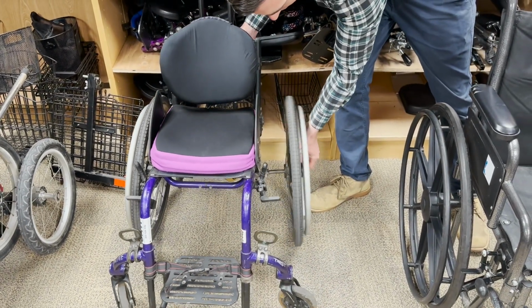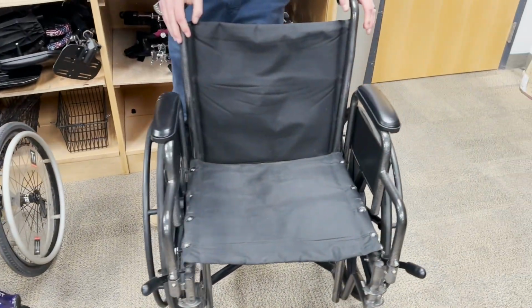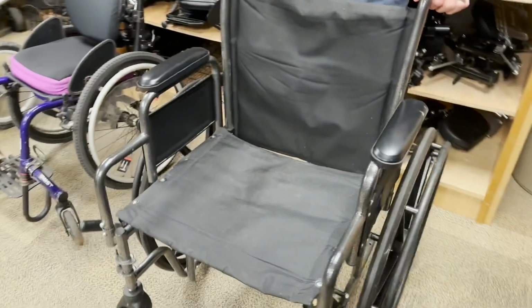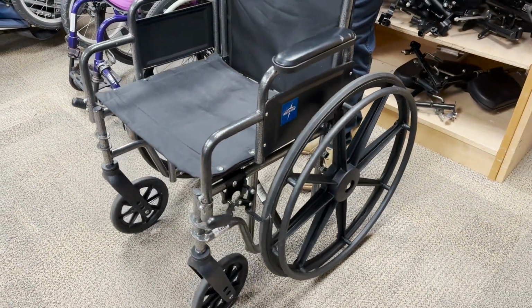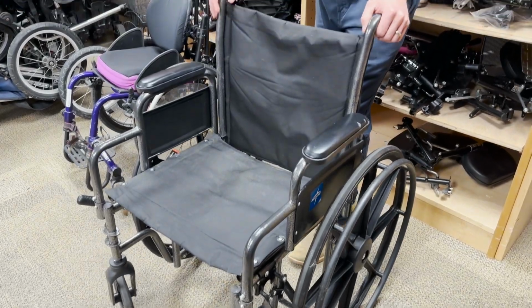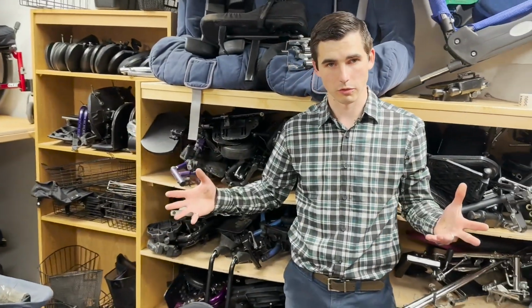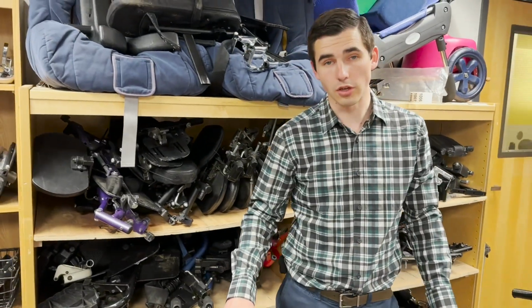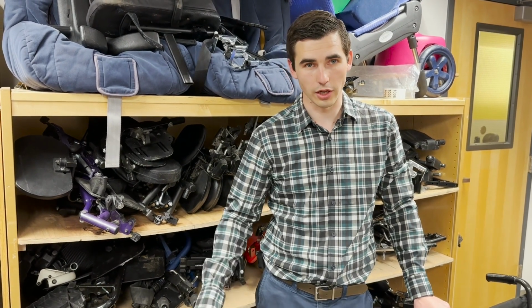As far as for the person, this is going to be for someone who is in this wheelchair for a short period of time. Maybe they don't have enough energy to get throughout the day, someone's pushing them, or maybe they're pushing themselves for short distances around the house. A rigid frame wheelchair is more for someone that they're living from their wheelchair. They're accomplishing all their tasks that day from the wheelchair. They're much lighter, they're much easier to maneuver and get into spaces and load in and out of vehicles.